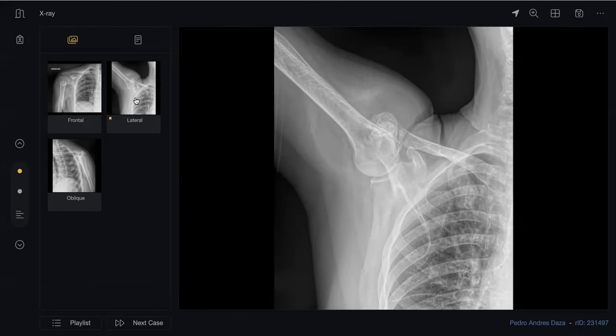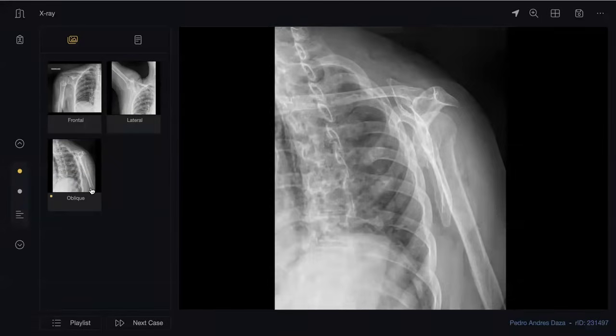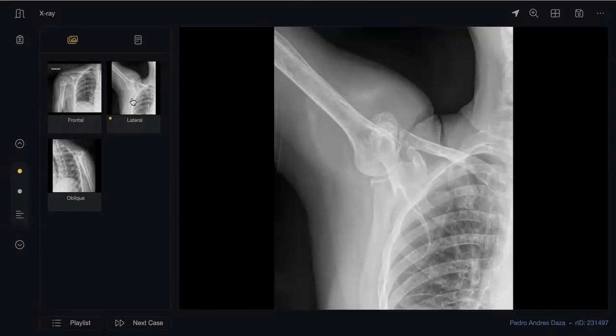It is a bony lesion. I'm not talking about a soft tissue lesion. Could be calcification, could be osteochondroma. Yes, now you're talking. Now prove it. Why is it osteochondroma? I need to review if the patient has any previous imaging. Well, this lesion is arising from the bone. Is it final that the lesion is arising from the bone?